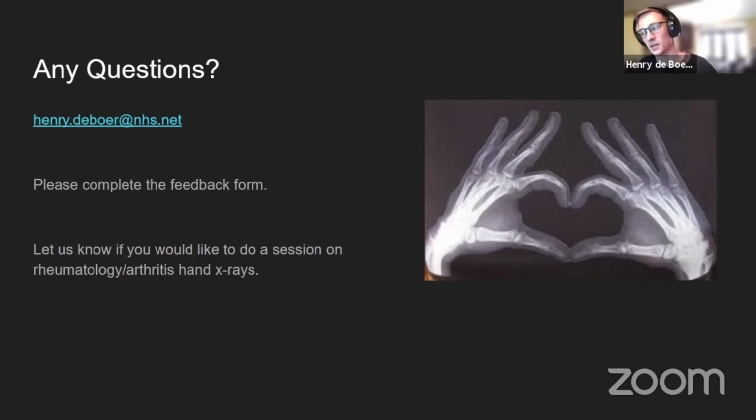So it could be a tendon injury or an avulsion injury. Most commonly it's an avulsion injury, but it can also be a purely tendinous injury. So if, rather than a fall and a fracture, it was a sharp injury or a laceration, you can cut the tendon, which would give you the mallet deformity but without a fracture. So yes, it can be just tendons.